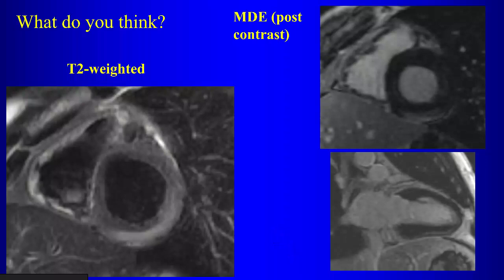No, there's no motion here, right? It's a still image. Your T2 weighted images, you're usually looking for what? Usually looking for edema, right? So do we see any areas of high signal here on this T2 weighted image, in the myocardium? Well, back here, along the inferior wall, we have this area of higher signal. So we do have some edema there, okay?